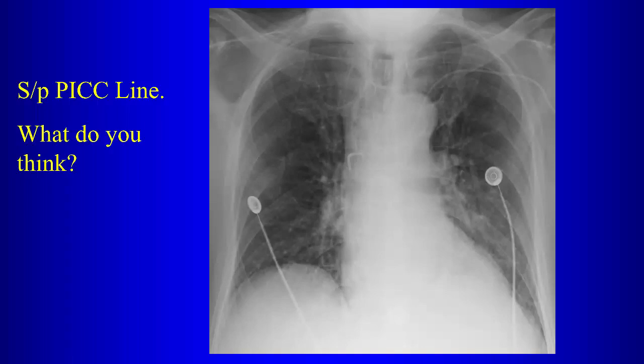Yeah, it should go to the SVC first. You don't think that's going to the SVC? Well, to say a catheter is going to the azygos, what do we look for?